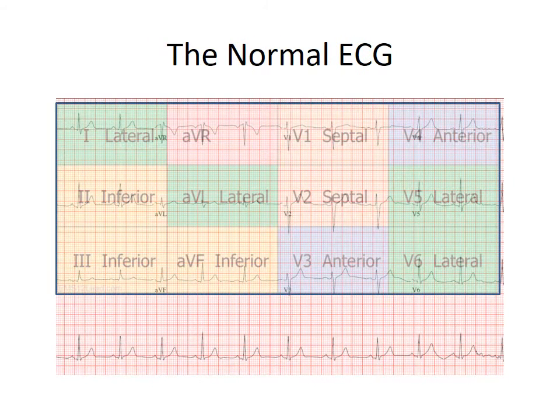All right. Next, this is just an overlay of the normal EKG placements. So when you have this, you have lateral leads in 1 as well as V5 and V6. You have inferior leads in 2, 3, and AVF. Your septal leads are V1, V2, and then you have anterior leads in V3, V4. And again, that's just showing you where the infarct is.